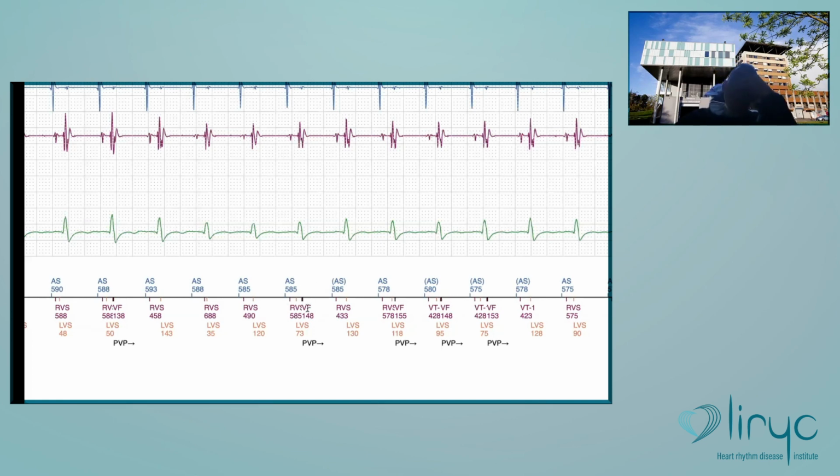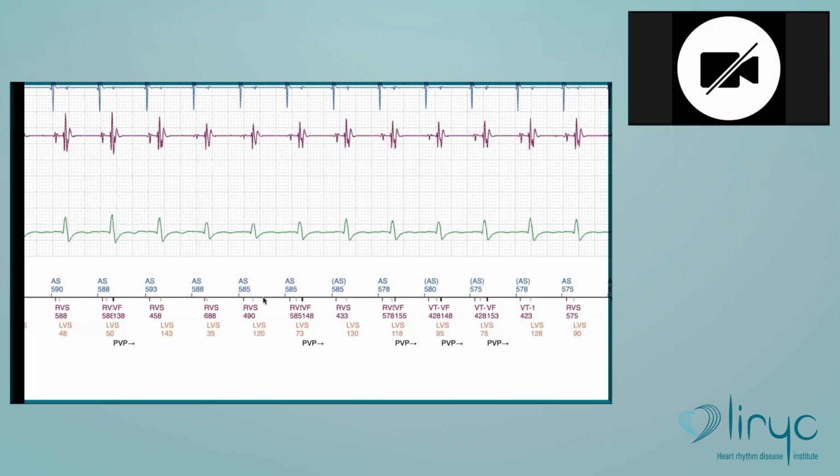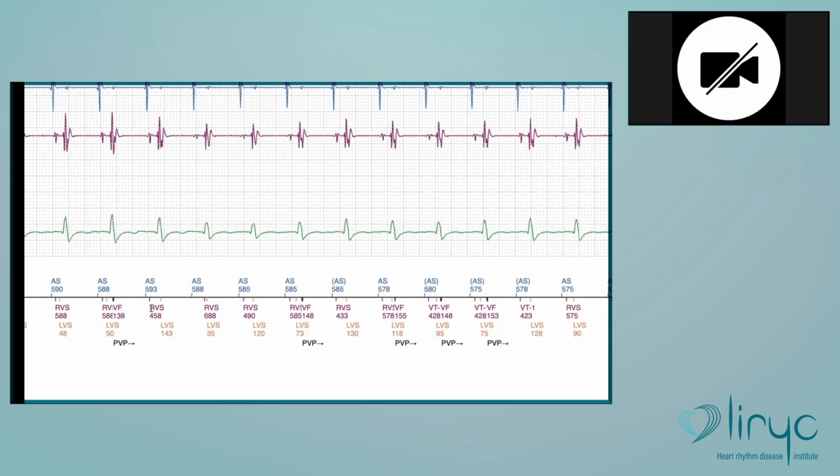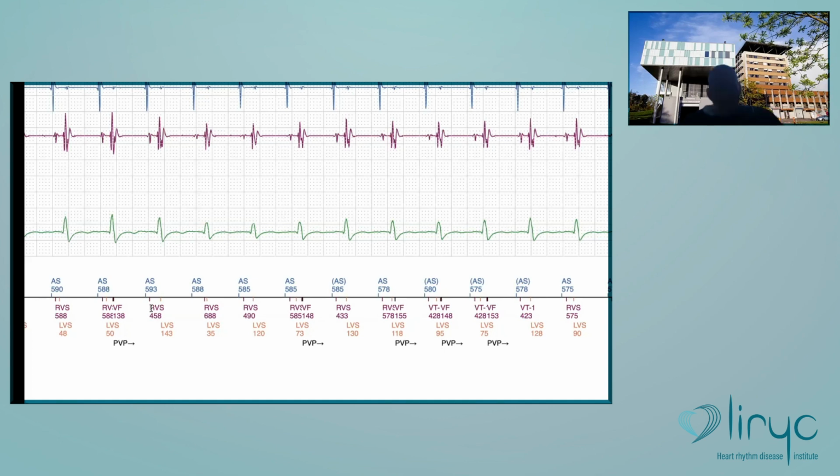What is the duration of the ventricular blanking post sensing in Boston? You know that? Once you have sensed a signal, during which duration can you not sense anymore in the right ventricle? 135 milliseconds. Yes, exactly. It's 135. You cannot modify it here.